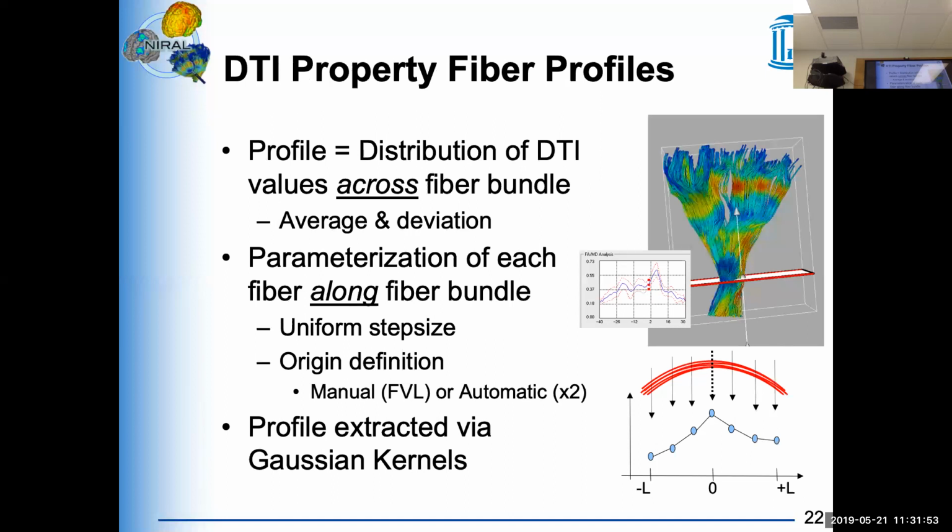And as soon as your plane is not just cutting the tract in one place, but in two places, then it becomes ambiguous where that starting point is. In such a case, you just have a bad origination plane. Usually there is a way to determine visually an origination plane that only cuts the tract once, not multiple times. You can use Fiber Viewer Lite to visualize that plane and see how it looks. So in such a case, you would need to adjust those planes.